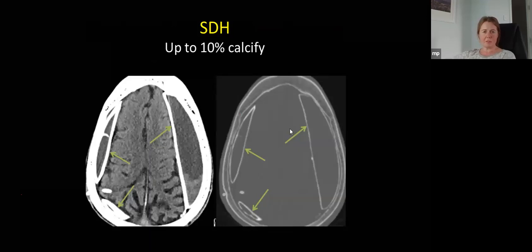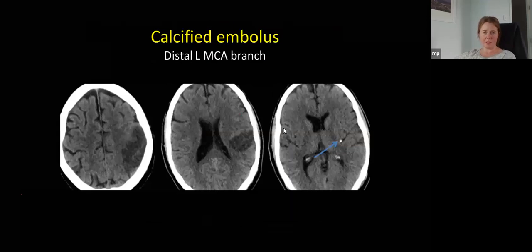So last couple of minutes, let's shoot through another couple of vascular things. You would think this had actually been drawn on by someone, but this is a case of chronic repeated subdural hematoma. It's pretty obvious. Obviously some old blood in here, some old blood here, and bilateral calcification.